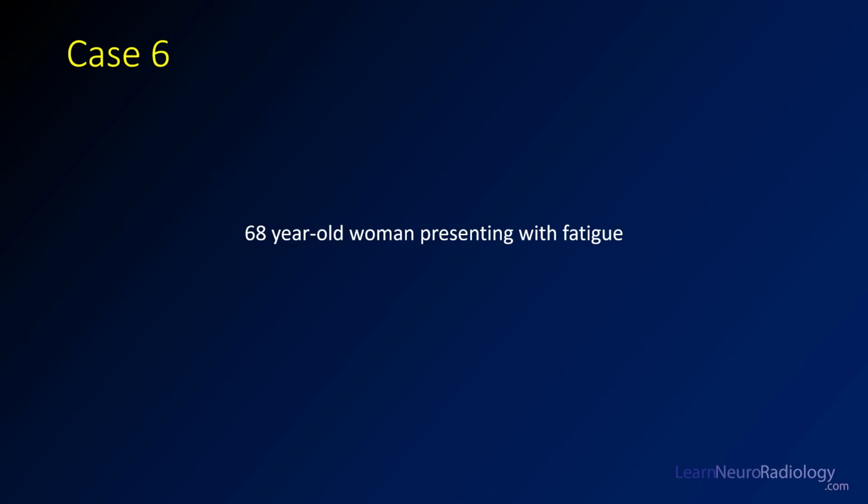It's another case. It's another brain tumor. Today we have a 68-year-old woman presenting with fatigue. It's going to be a little harder on your test because you're not necessarily going to know you're dealing with a brain tumor, so always keep that in mind.